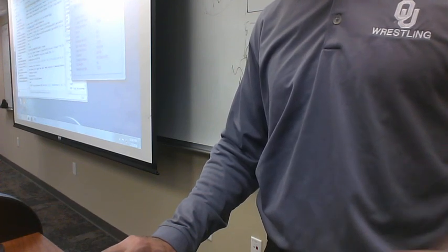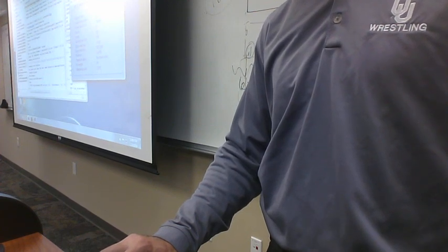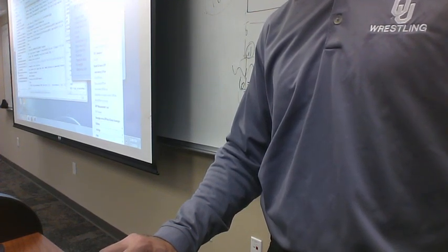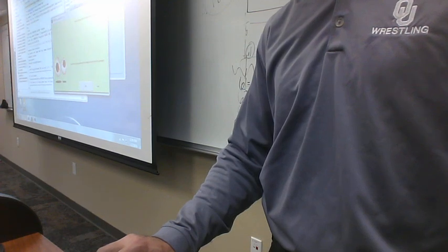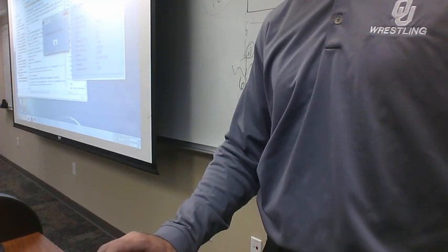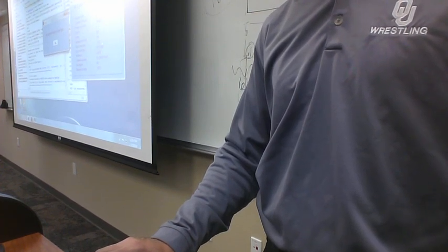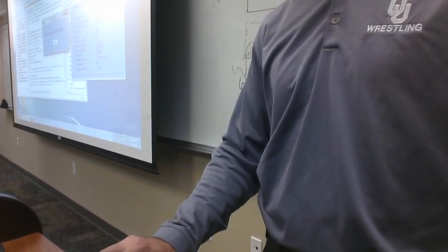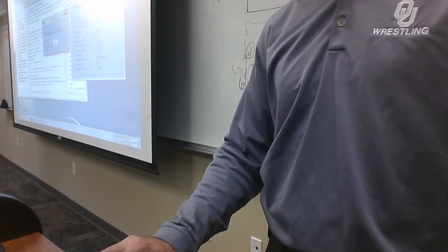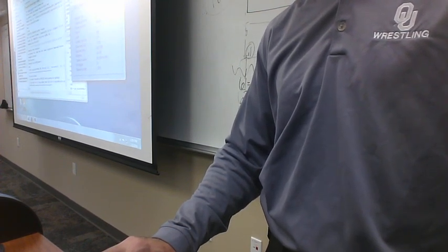Now, let's see here. We can now do something like, might be able to extract bin-based epochs. Oh, can't do that. Yeah, are there questions on this stuff? I have a quick one. Yeah. What are the frames per epoch? I noticed it changed from like 3 million. You know, I'm not entirely sure, to be honest. It's not something we ever really deal with. So no need to worry about that.